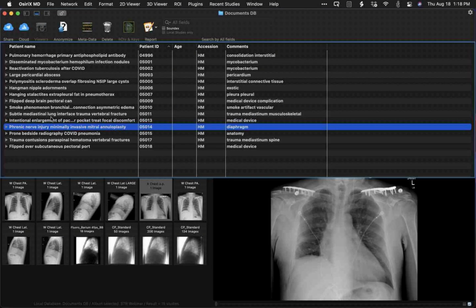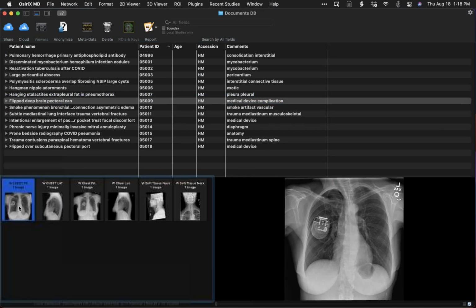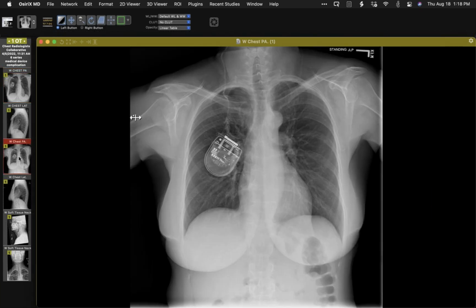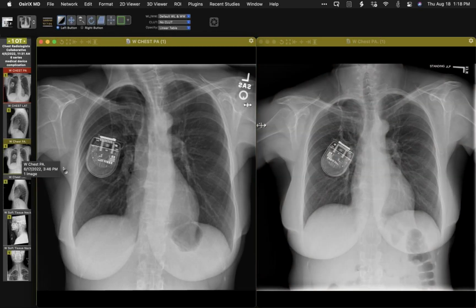Very helpful again with eventration versus paralysis is that the anterior eventrated portion of the right hemidiaphragm may show no motion on a deep inspiration, may just sit there. But if you observe it posteriorly on your lateral view, you will see that there's vigorous motion posteriorly over the vertebral bodies. So if you don't have a lateral, you will confuse eventration with paralysis.